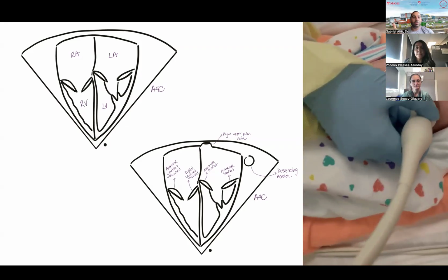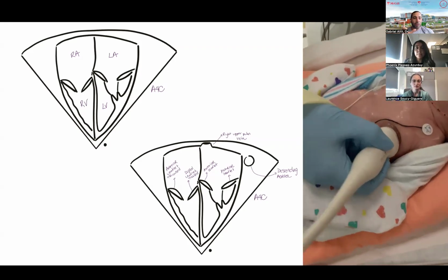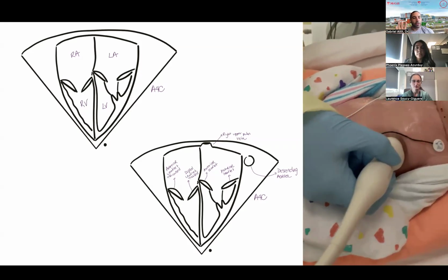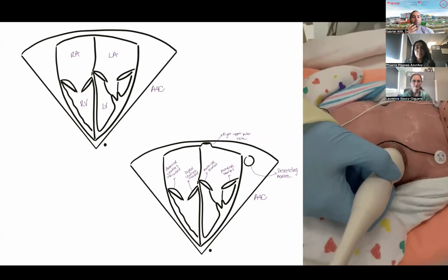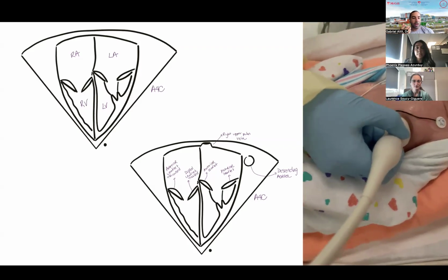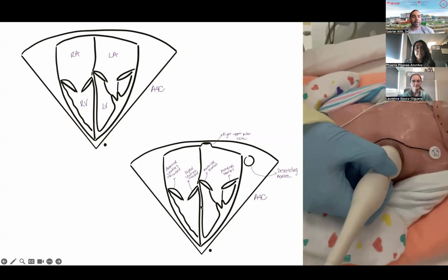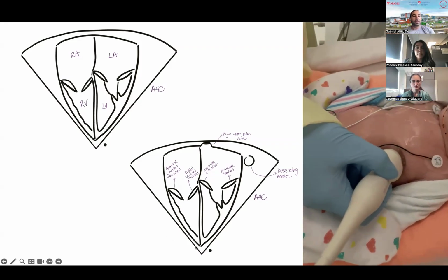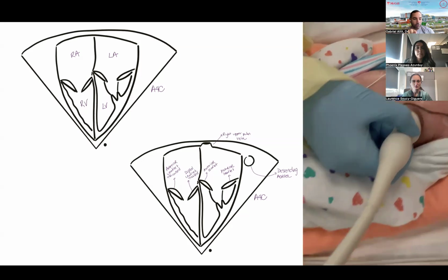But this is an anterior posterior view, which has basically the posterior wall of the RV and the anterior wall of the RV, which are very contractile too. You want to look at the entire body of the RV to understand its contractility, but it's not the most contractile portion of the RV. So the most contractile portion of the RV is really this wall and the septum that typically will bulge into the right ventricle. And that's why the American Society of Echo is still recommending that we do the fractional area change in that particular view.